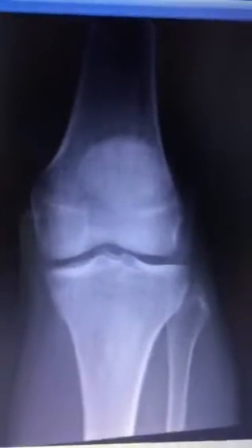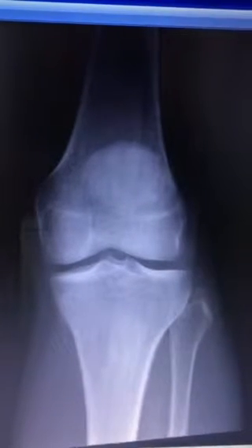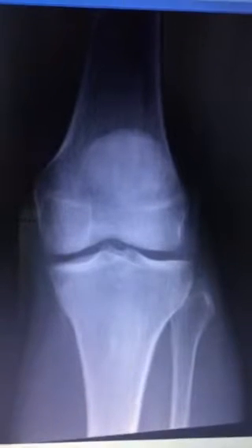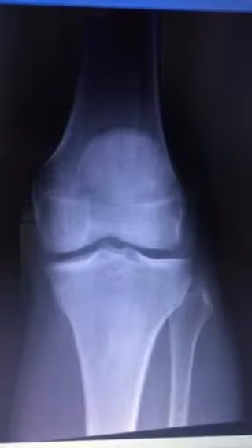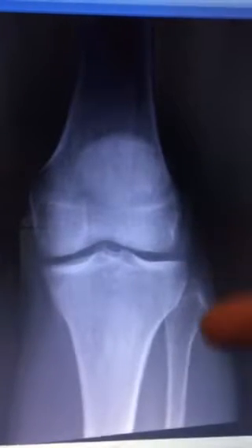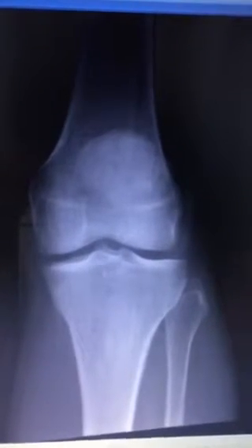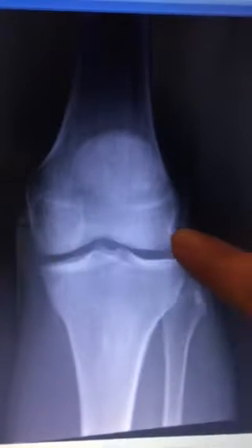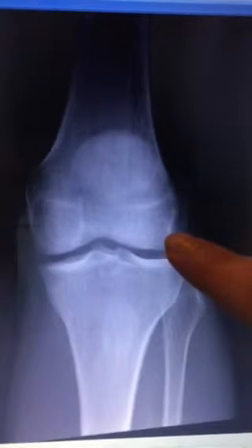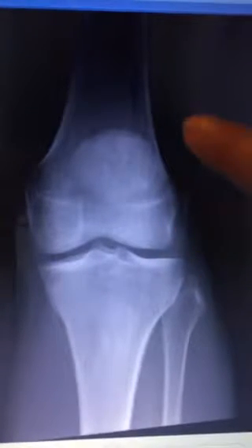So, just evaluation criteria for a proper X-ray. The main thing in all images should be proper collimation around the body part of interest. Depending on the patient's condition, if it's possible, the knee should be fully extended. Condyles: femoral condyles should be parallel to the IR.